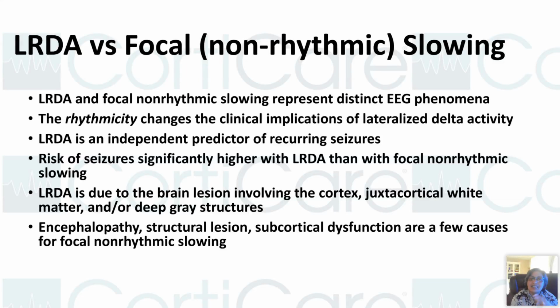LRDA is independent of focal non-rhythmic slowing, and it is an independent predictor of recurring seizures. Risk of seizures is high with LRDA compared to focal non-rhythmic slowing.